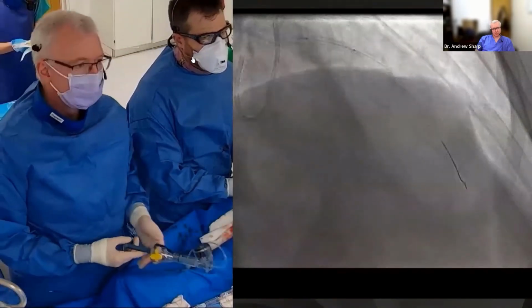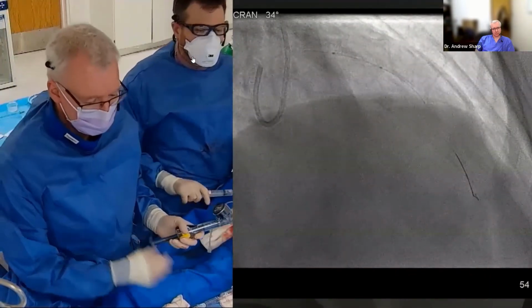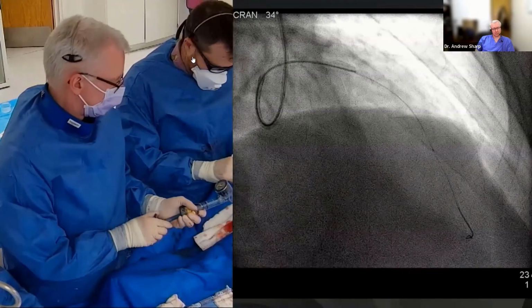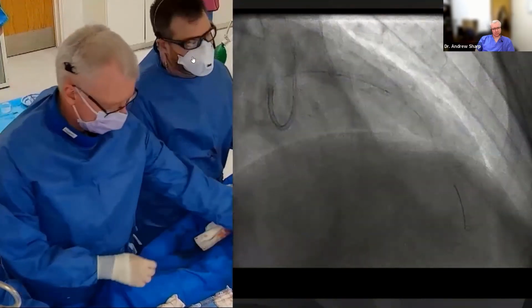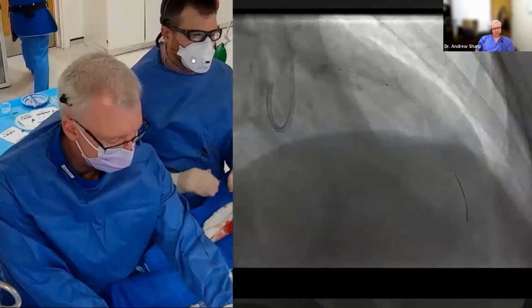Just go back a picture for me, Rach. What? 8. Okay. We don't have a 6 anywhere. Good. Yes, please. Yeah, 6 would be better.